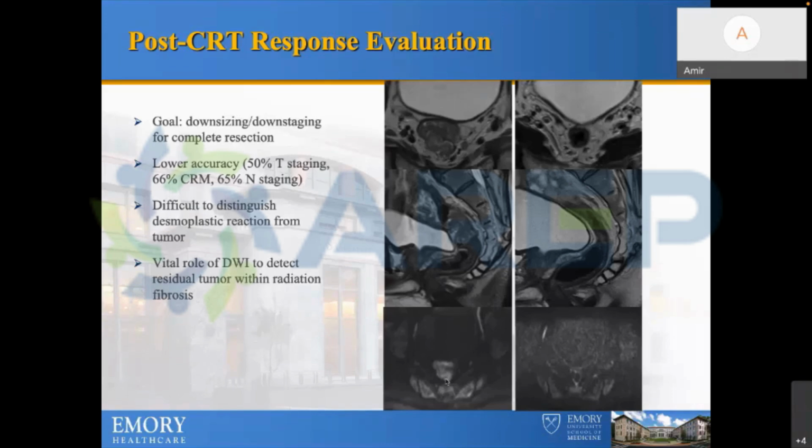So basically, we definitely have to see the baseline imaging, and then qualitatively we look at the pre-treatment scan, and then compare it to the post-treatment scan. In this example, there are always some structures on the DWI that are bright. Look at the lymph nodes, for example, and use them as an internal reference.